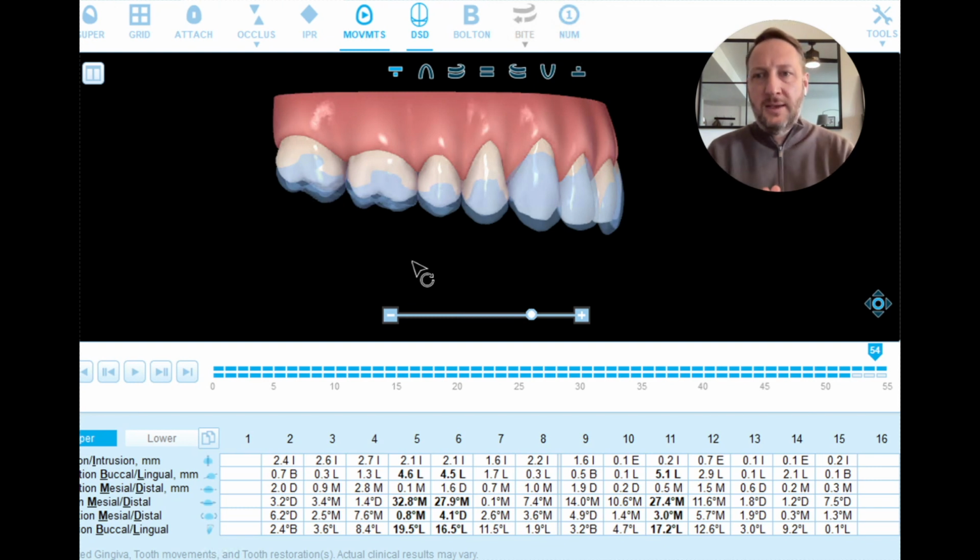So even applying sequential movements and even adding overcorrection, in this kind of case we are still recommending the use of skeletal anchorage, that I'm going to present, how we plan it and how we use it for this case to facilitate the insertion of the TADs, the implants, in the best position possible so we can have the best anchorage system for this case to help in these intrusion movements.